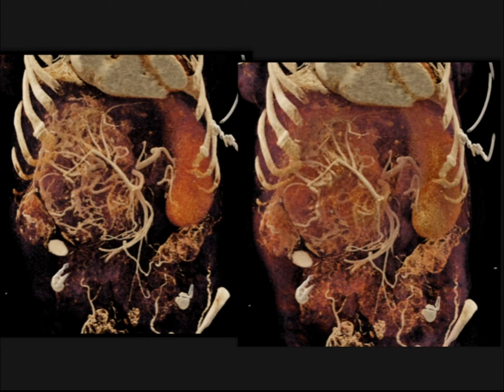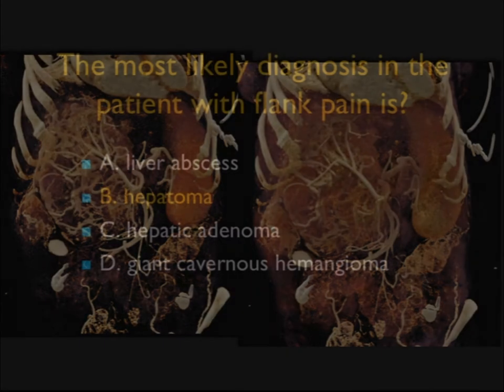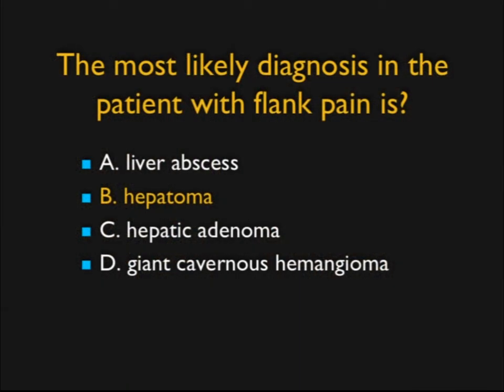This is neovascularity. Yes, I could argue it could be hepatic adenoma, but this was a hepatoma. Just a beautiful example. If it was a hepatic adenoma, it would be a malignant degeneration of hepatic adenoma into hepatoma. So hepatoma is the correct answer.